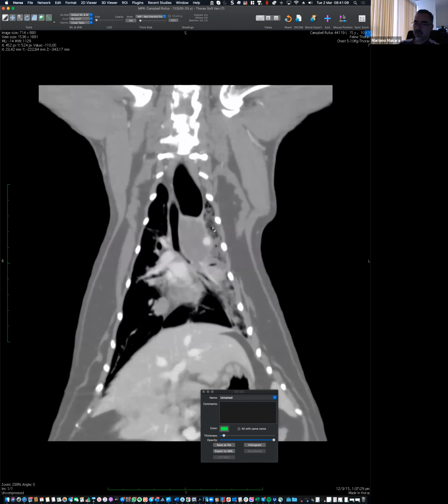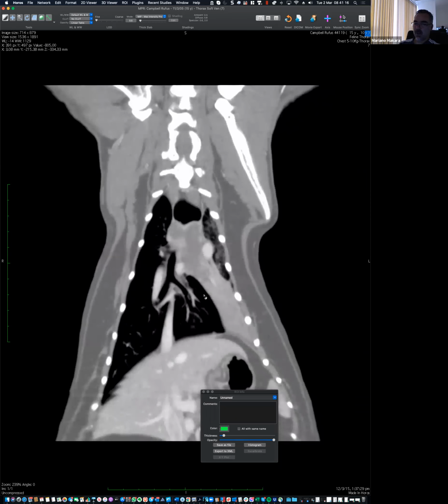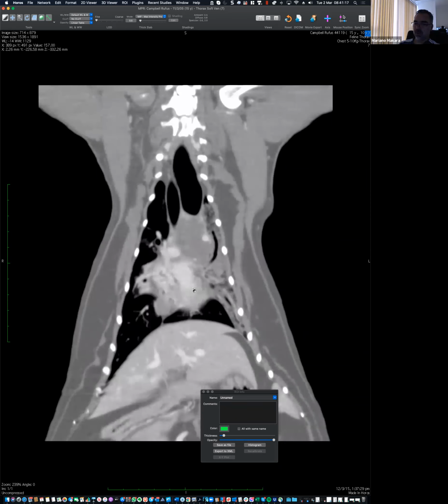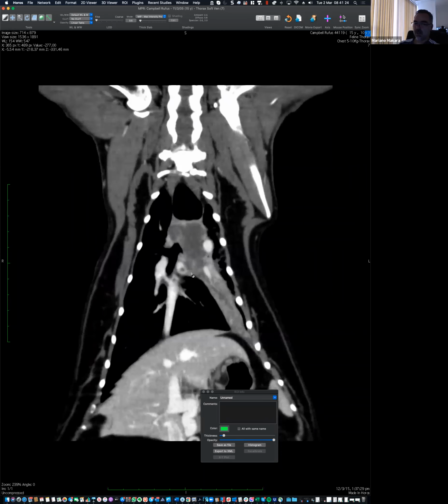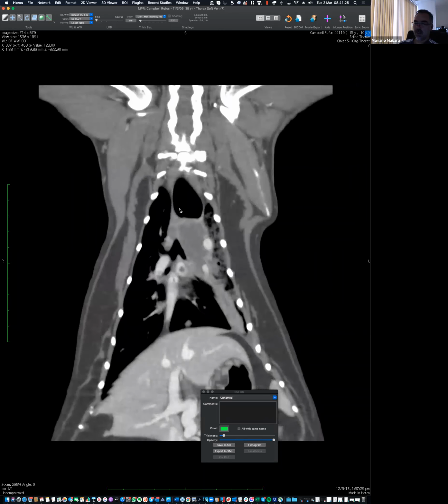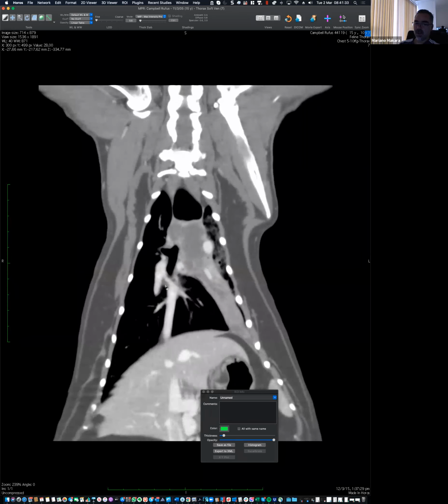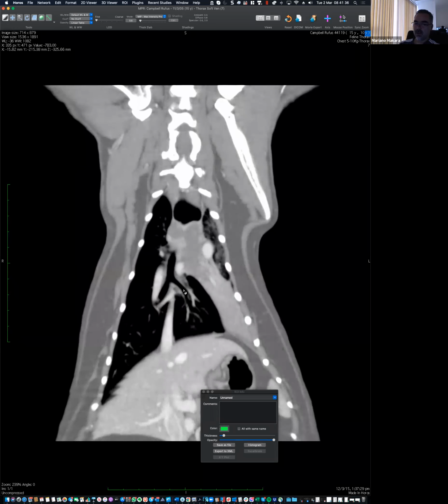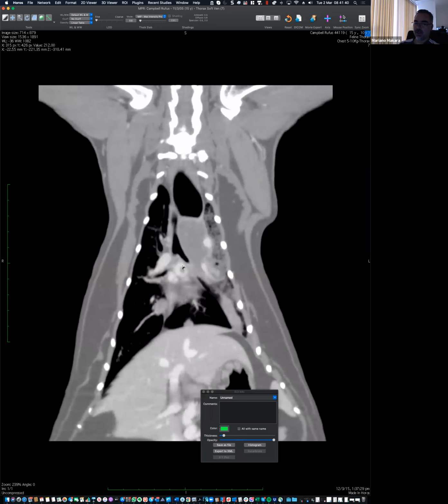Reduced volume, increased attenuation, normal right side. And then if we go more dorsal, there we go. So if we follow the airway, good. This is the trachea, and you will see that it goes to the right lung lobes, it's open, no problem. Makes sense, main bronchus to the accessory, right caudal, right middle, no problem. If we go on the left, we follow it for a little while and it collapsed.